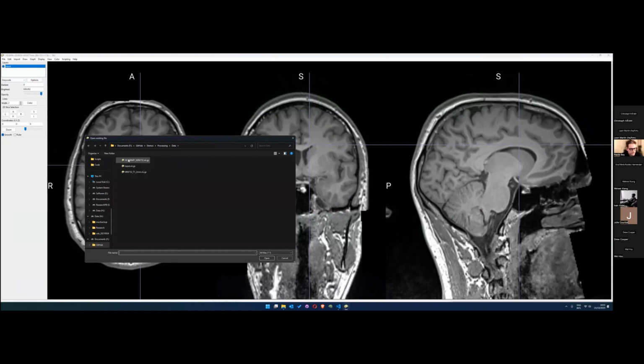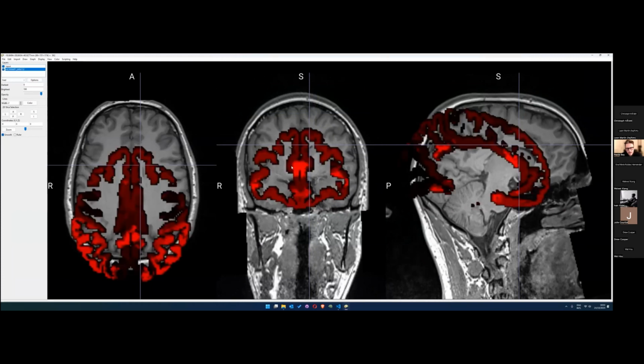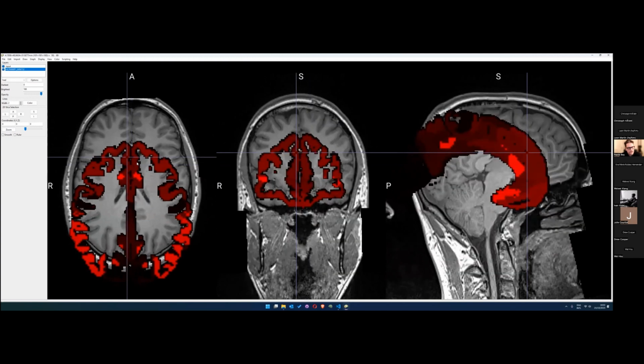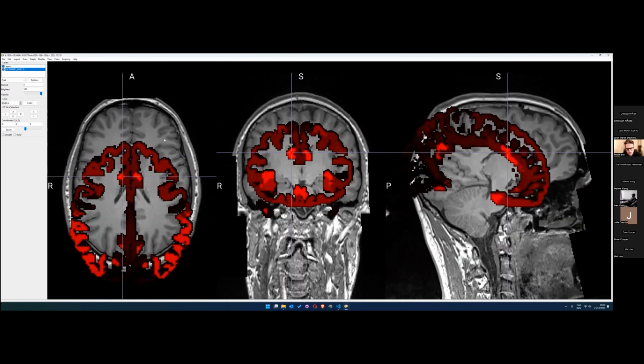Here we have the image already, HCP MMP1 in MNI 152, so basically in template space. If I overlay this data, we see it does not fit my brain. This is exactly what I mentioned before during the registration discussion: those live in totally different spaces. The atlas itself is in MNI space based on 152 healthy controls, averaged into the same space.